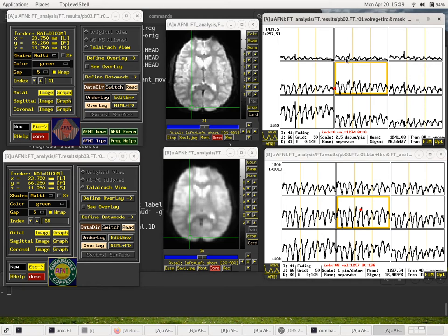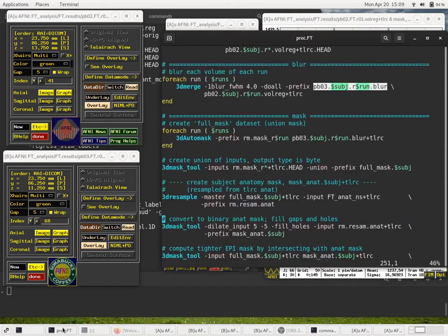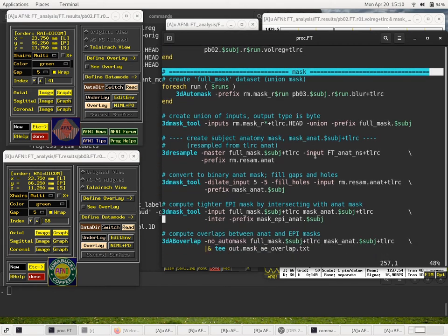So you notice these spikes up here in these 3 time series, and even in the lower left one, those are smoothed out quite a bit here. So that's an effect of blurring. But otherwise, the values are around the same range. So going back, that's enough of a look at the blur. It's not too hard to understand. Now let's look at the masking step.